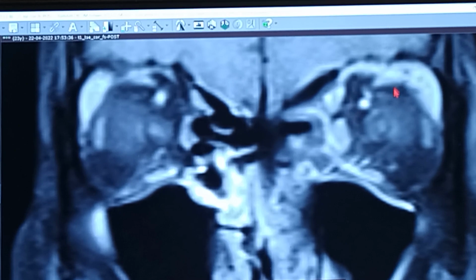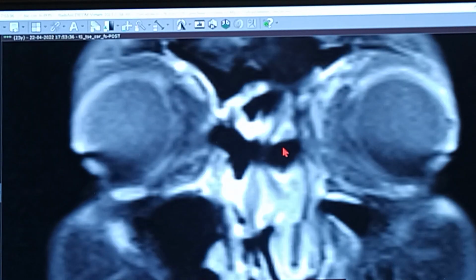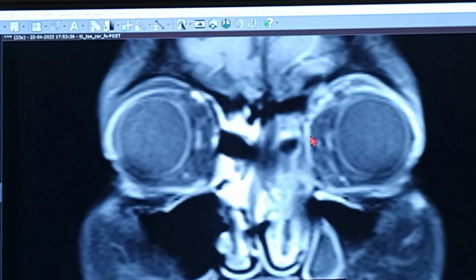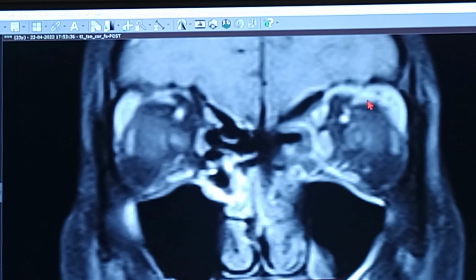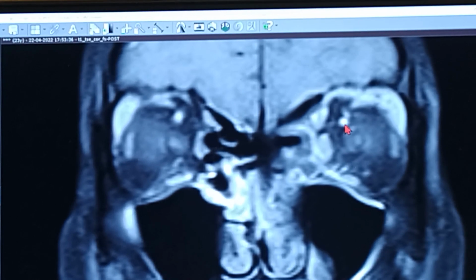Exactly above the superior rectus runs the levator palpebrae superioris in the most anterior part. You can see this is the superior rectus muscle. This is a medial rectus. That's the ophthalmic artery right there. This is the ophthalmic artery, which comes as a branch from the internal carotid artery on the lateral aspect. It runs along and under the optic nerve, and then it goes superior to the optic nerve from lateral to medial, and then travels superior to the optic nerve medially.